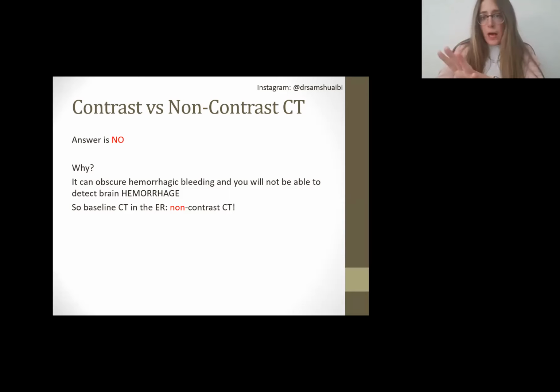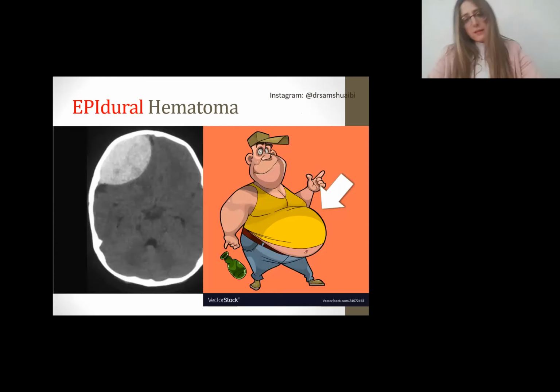And then when we rule out hemorrhage, because in the non-contrast CT, if there is white, I will know it's not the contrast, I didn't use contrast. I will know this was purely the bleed if it was there. So anytime the person has that, use non-contrast CT, and if there is no hemorrhage, then we can start the stroke protocol. So let's get into it.